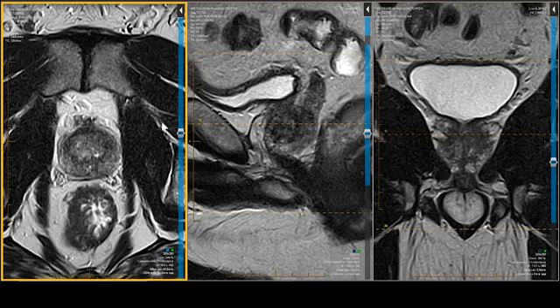And then I would go over to my diffusion image to check out the absence of any diffusion restriction whatsoever to give this a PI-RADS score of 1. Remember, the major criteria for the central region, the T2 character: no dominant nodules, no dominant masses, no charcoal-like, erasure-like masses that cross boundaries. And we don't have that.